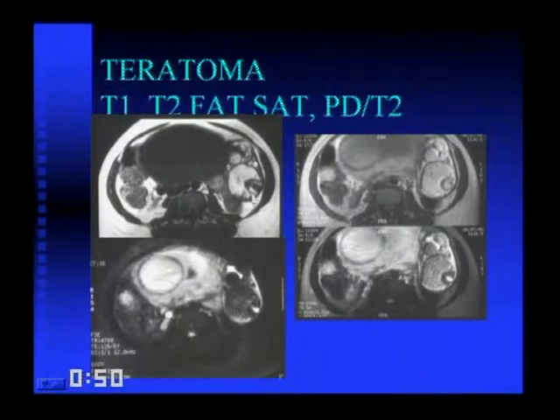There's areas that track fluid here and here. And then other areas that track soft tissue density. After she delivered, it was resected.